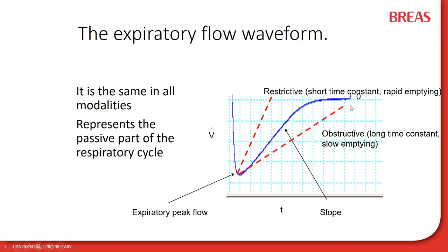In certain situations, the zero point is not reached, and this is traditionally linked to the concept of expiratory limitation. And in the restrictive patients, there is a short time constant with a rapid emptying.